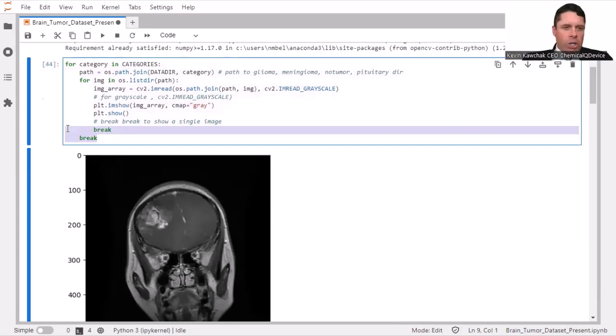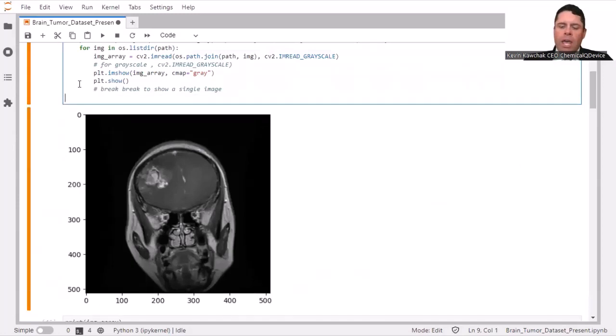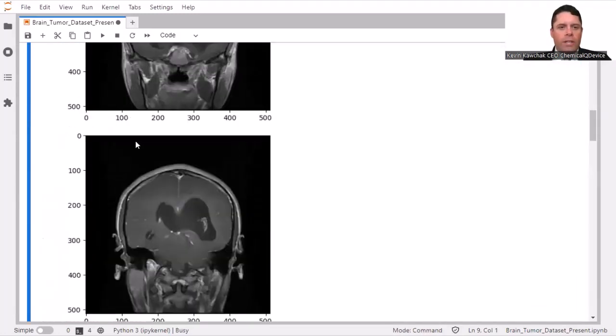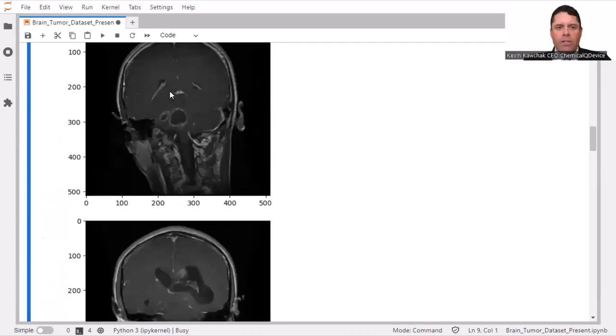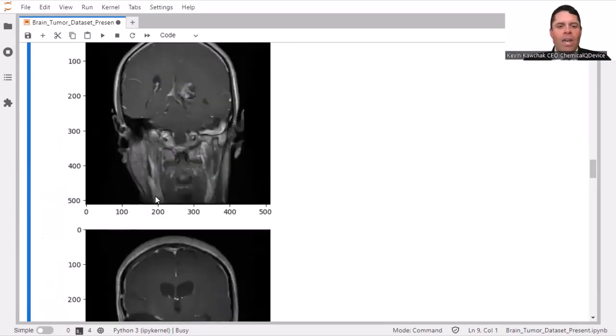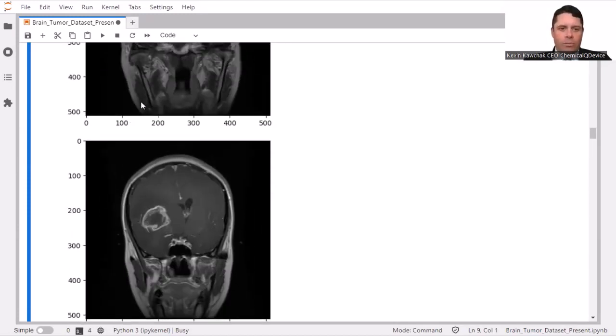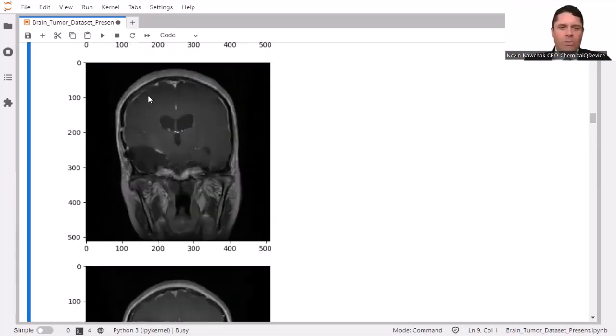But I took a couple of tutorials on it. So it's just showing, for instance, this single image now, because the code's saying to break at this point. If I take that out, it'll start to go through all of these brain images. Now, keep in mind, you see this is the back of the head. In these data sets, whether it's cats and dogs or MRIs, you get a whole slew of different images. This is a Kaggle database with 4 different types of brain classified images.